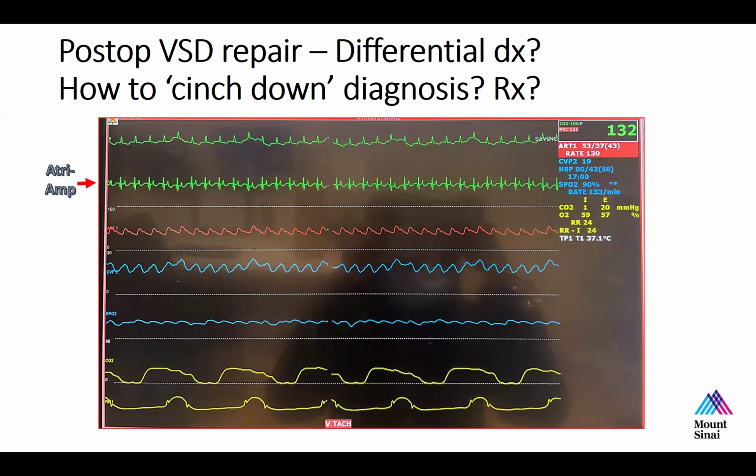Now, as you get older, a lot of people lose retrograde conduction in their AV node. So not everybody conducts retrograde in their node. But generally speaking, most people have bidirectional conduction through their AV node. So this probably is a ventricular rhythm with ventriculoatrial conduction, with one-to-one VA conduction. That's one possible differential. Now, how would you know if this is VT or not? In other words, you've just told me that your presumption is it's VT because the QRS is wide, and that's a reasonable presumption.